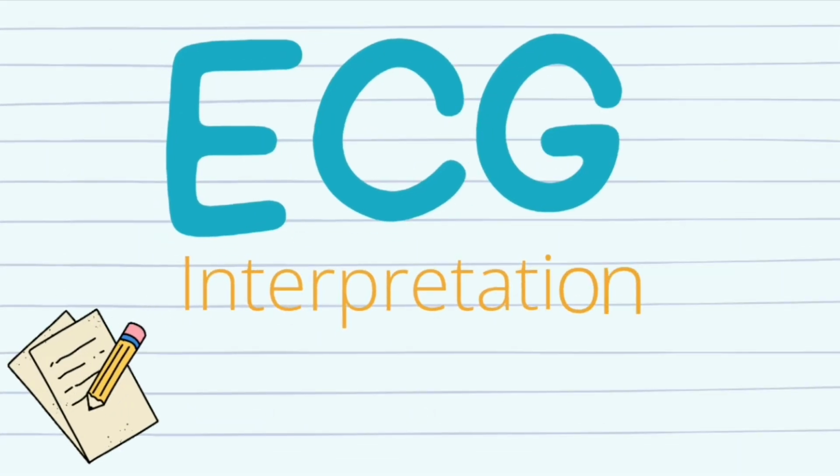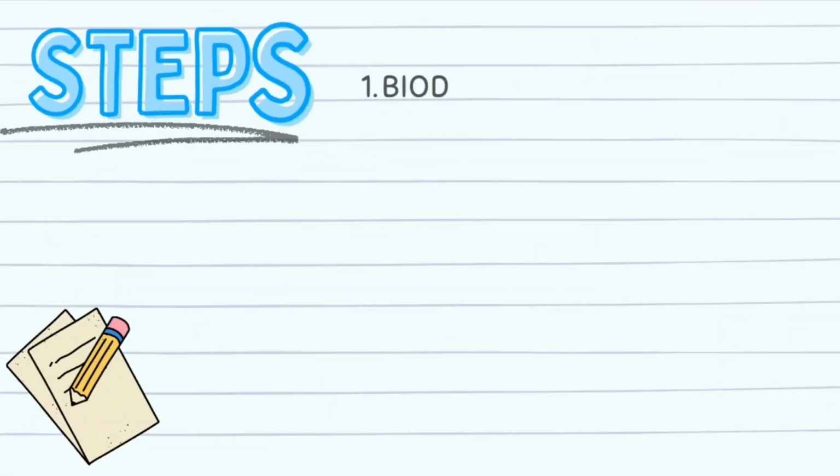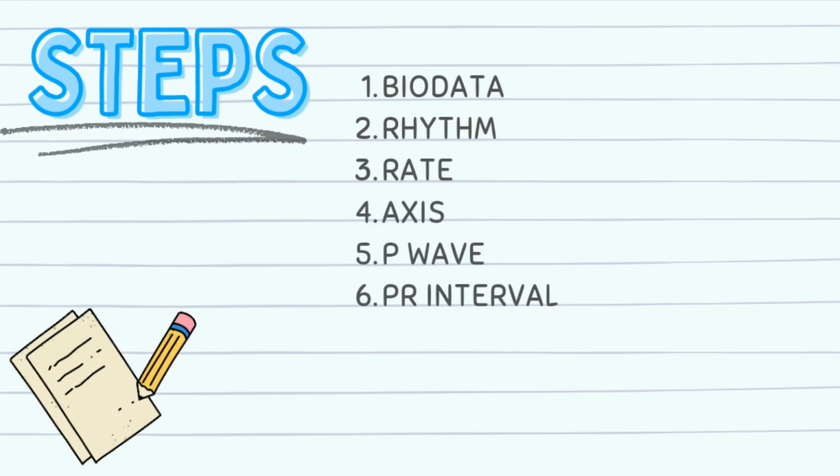ECG Interpretation, Part 2. We will use these 9 steps to interpret ECG.